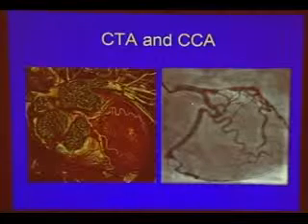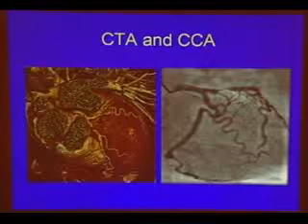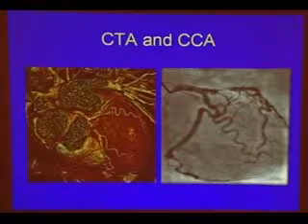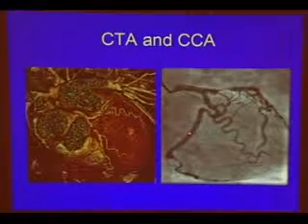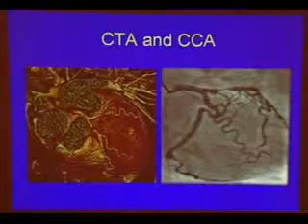Now, here we show the coronary catheter angiogram picture. Okay, so this is a non-invasive picture. This is an invasive picture. So again, I'm stressing the non-invasive imaging that we are able to obtain today.